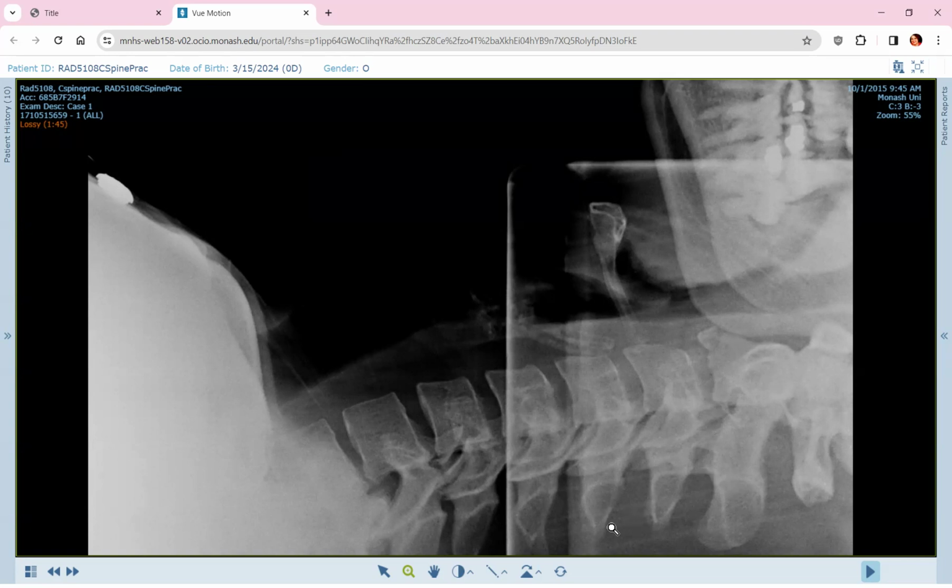There's no other fractures visible. And then there is also a malalignment as well, and we can see that at the posterior vertebral line. This is, of course, also described as a flexion teardrop fracture. So we have a flexion teardrop fracture of C2 vertebral body.